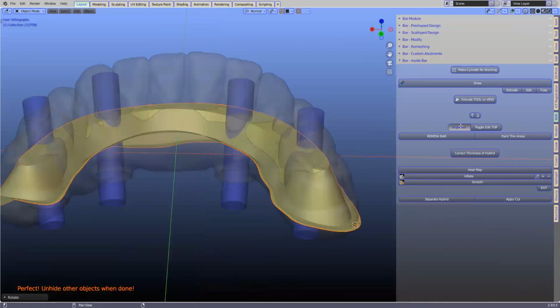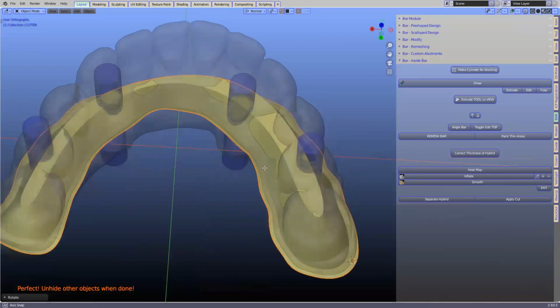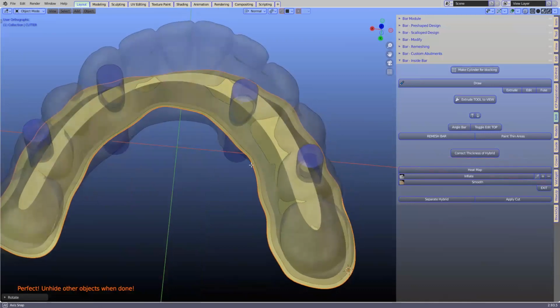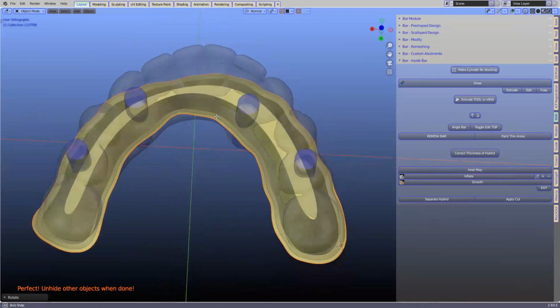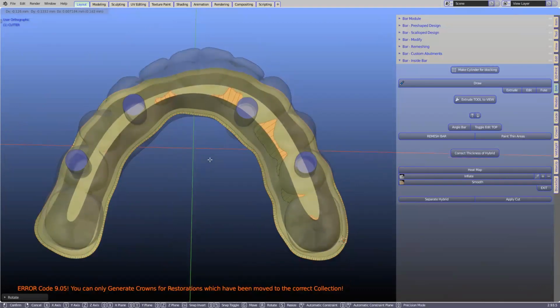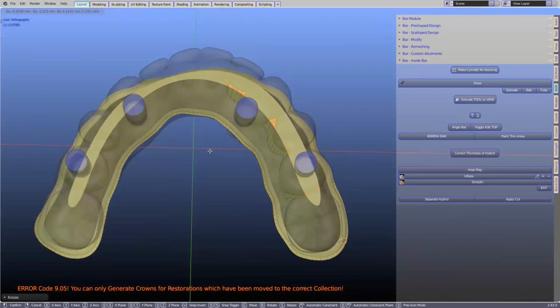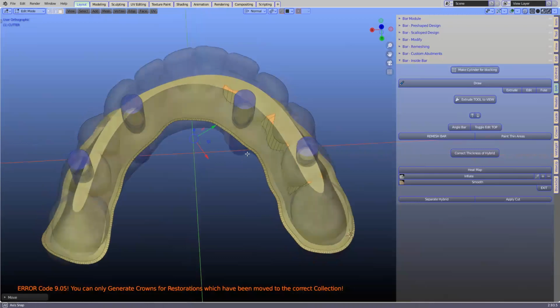So I'm going to angle this quite a bit actually, to minimize what is actually sticking out. And then what we need to do, well, I can bring that forward a little bit. So let's edit the top of it, and I'll just use the G key and move that forward just a little bit, just to minimize the exposure of this bar. Okay, something like that.